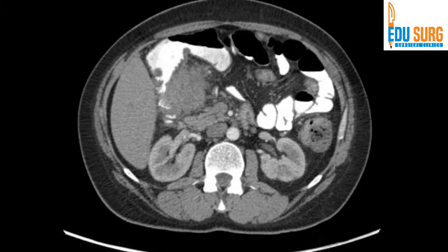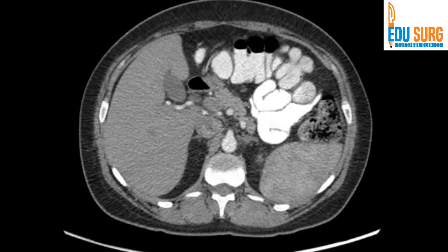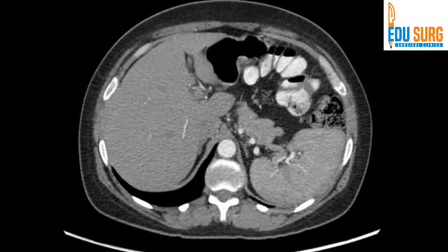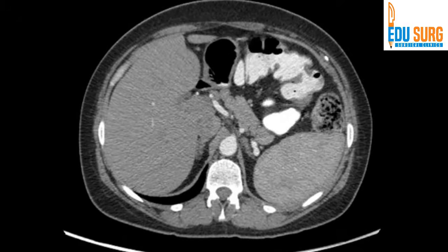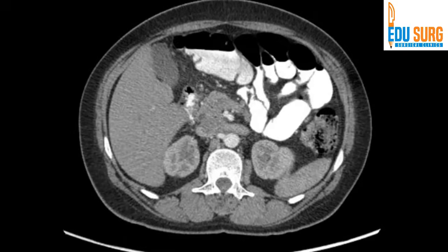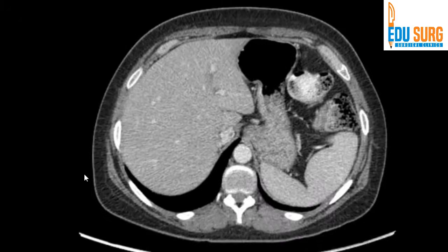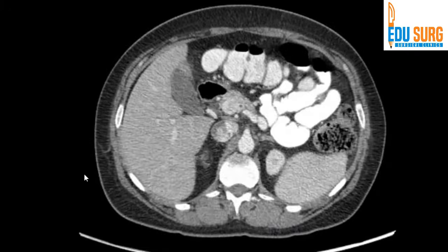So you can note down the phase, the findings that you can identify in this case. And once everything you have seen, we will discuss one by one. So at least which phase this is, what disease the patient has. If there are any variations, you can have a look at that as well. Okay, going to the next phase. Again, identify the phase and then identify the findings.